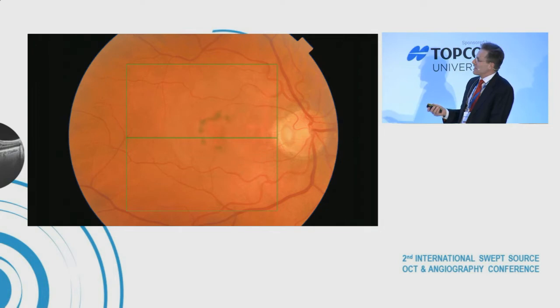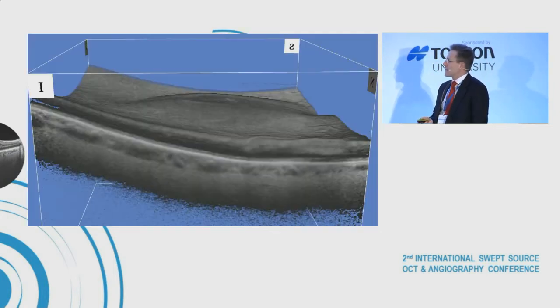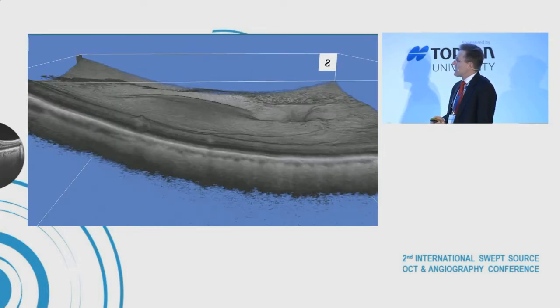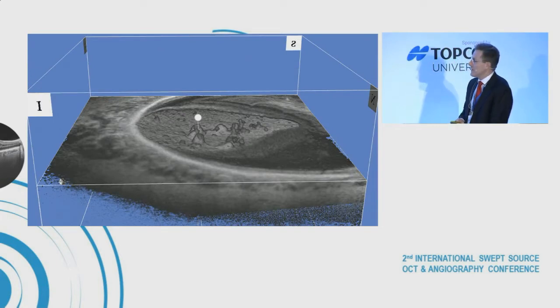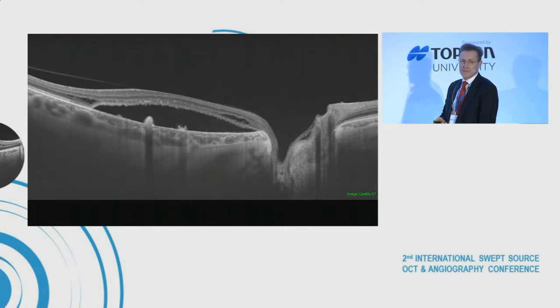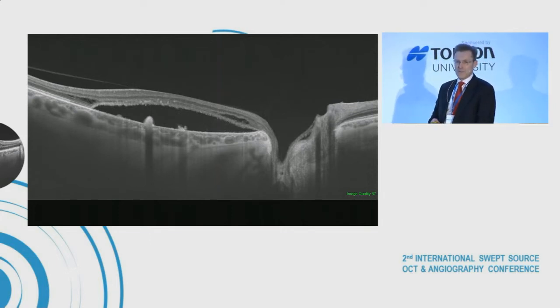And here's a patient who has sort of like a Stonehenge underneath his macula. Look at the black dots here in a semicircular ring, and here they are, pigmented they appear, although that may be a matter of reflection, of retroillumination. And let's look into the cave here. Here we have taken the lid off, and you see Stonehenge under the macula, and this is the roof, and here is the chronic serous detachment, and the strange debris may be pigment epithelium proliferation underneath it.